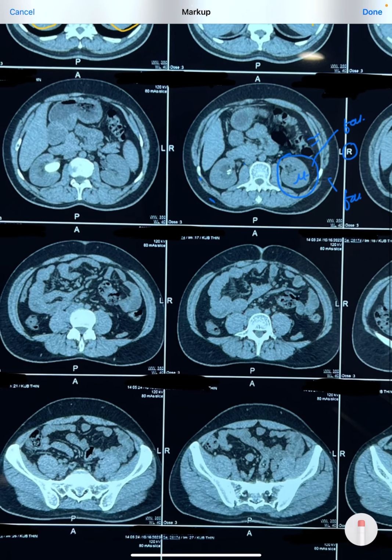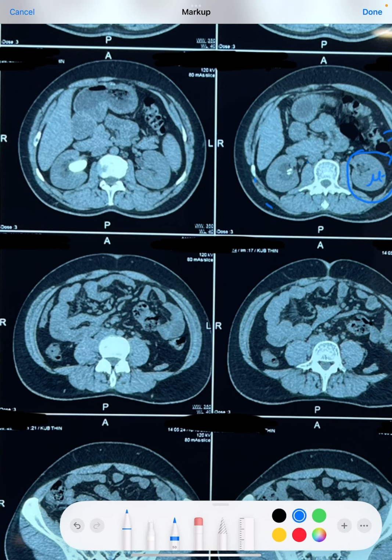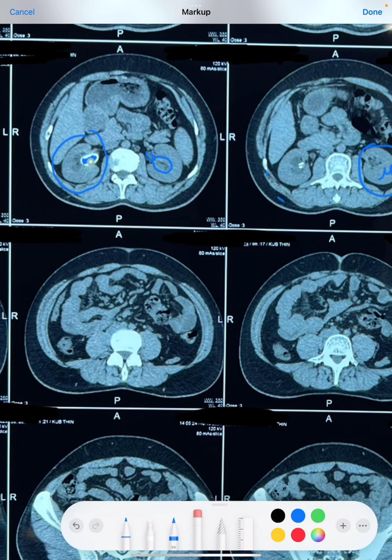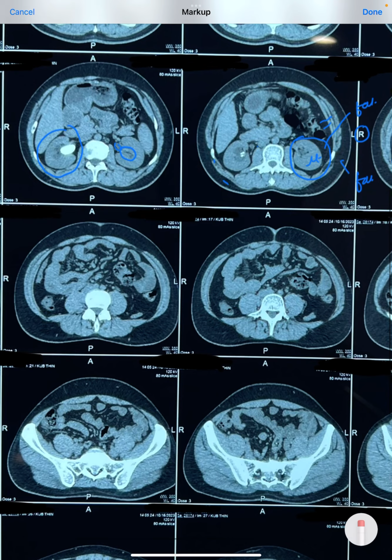So just compare this left kidney, this is the pelvis part. The pelvis part means the pelvicalyceal system through which the ureter arises. So this is the part of ureter. But on the right side, what we can see, there is a dense white structure. So we know this much dense white structure is only always bone or calcium or blood.